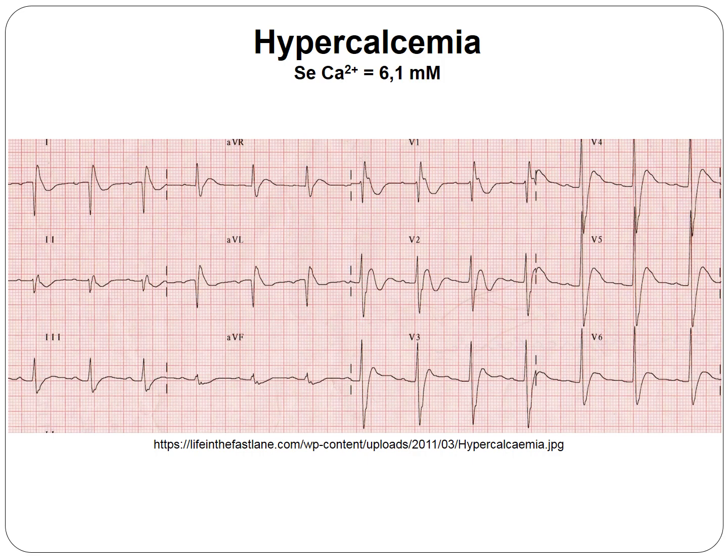The PR interval is lengthened, as you see here. The QRS complex looks wide, but it's not wide. It's only the J wave, or the Osborn sign, that can be seen here. This is why it's not widened. The axis is extremely right deviated.